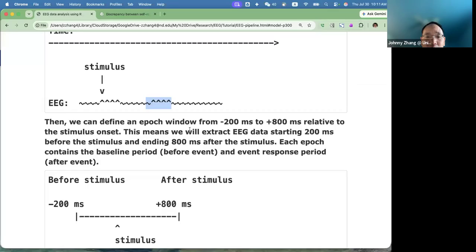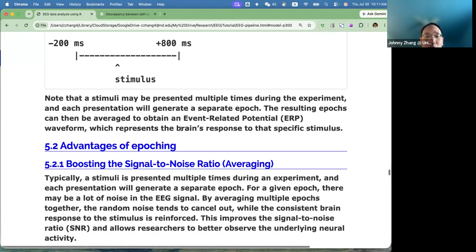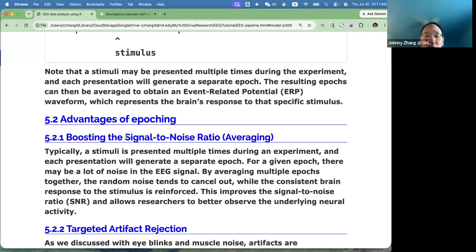Both are non-social images, about the same type of image. So I can average the signal here with the signal here, and by adding the information up and averaging, we can reduce the noise in the resulting information. For example, for one experiment we may have 50 trials, and we can average the information from those 50 trials, and then we get much more reliable signals for that epoch.